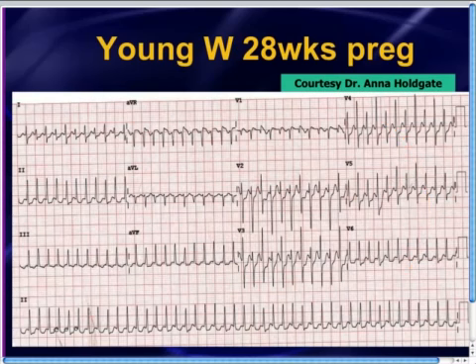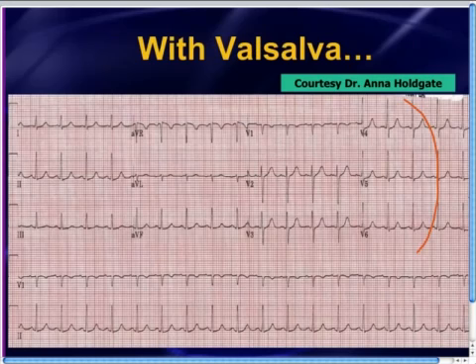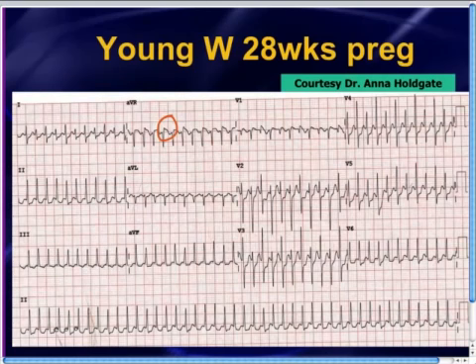And actually, one third point that I'll make. We've talked about ST elevation in aVR as a sign of left main coronary occlusion in patients that are presenting with cardiac ischemic symptoms and sinus rhythm. However, I think I mentioned this on a previous podcast. It's normal in some patients to have ST elevation in aVR in the setting of SVT. So if a patient has ST elevation in aVR in the setting of an SVT, it doesn't mean anything as long as it goes away when they convert back to sinus rhythm. You can see the aVR ST elevation is gone, okay? So when you see ST elevation in aVR, if it's in an SVT patient, it doesn't mean anything, all right?